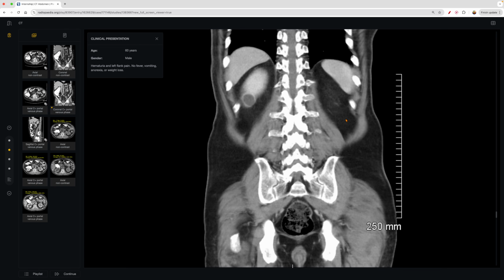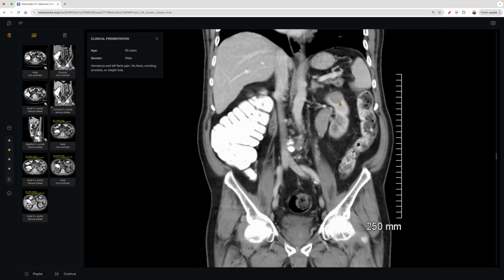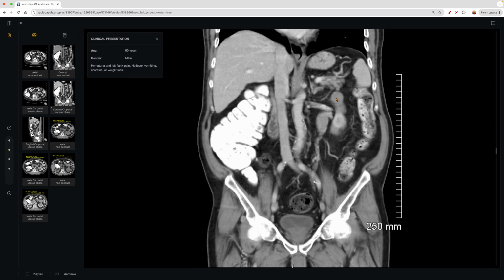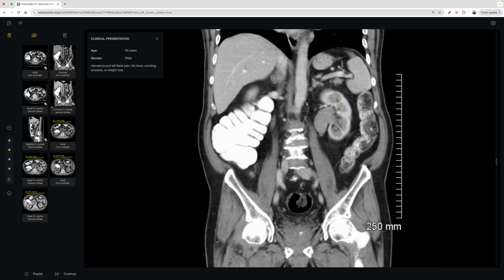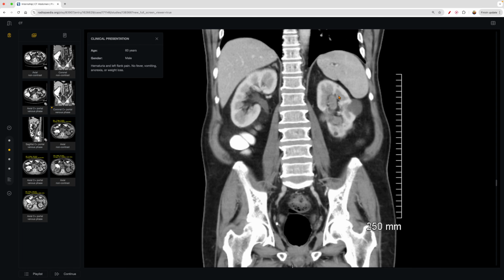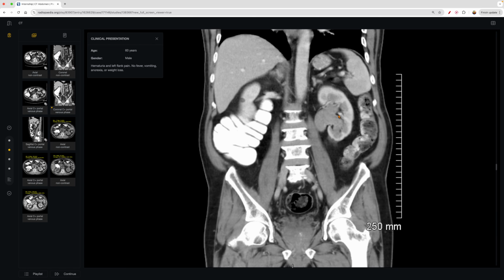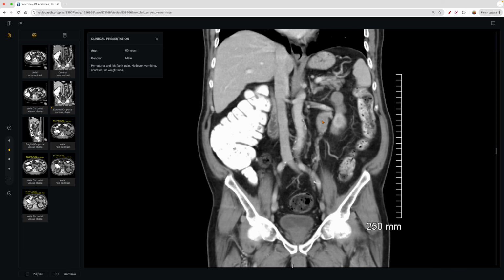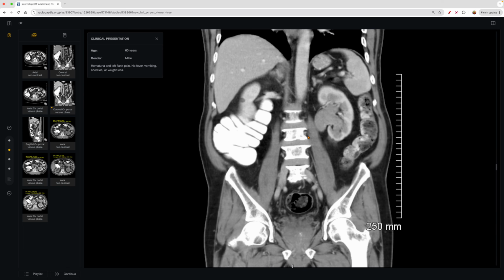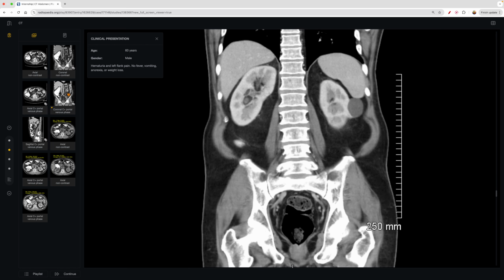So you can see some renal cysts, but what is different about this portion coming off, while looking like a cyst, is that it isn't the right density, right? It looks like the renal medulla. And then we see here, this is definitely darker. And then we come in here, there's something going on within the renal pelvis as well, right? So there's certainly something interesting to comment on.